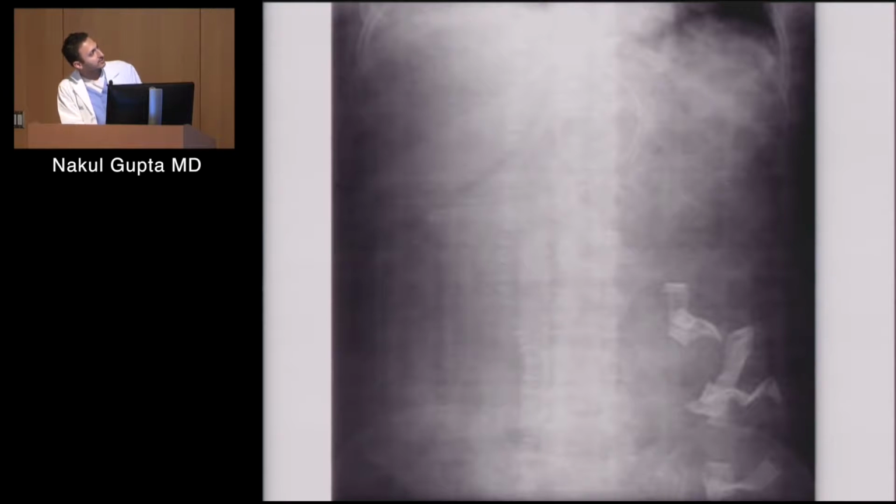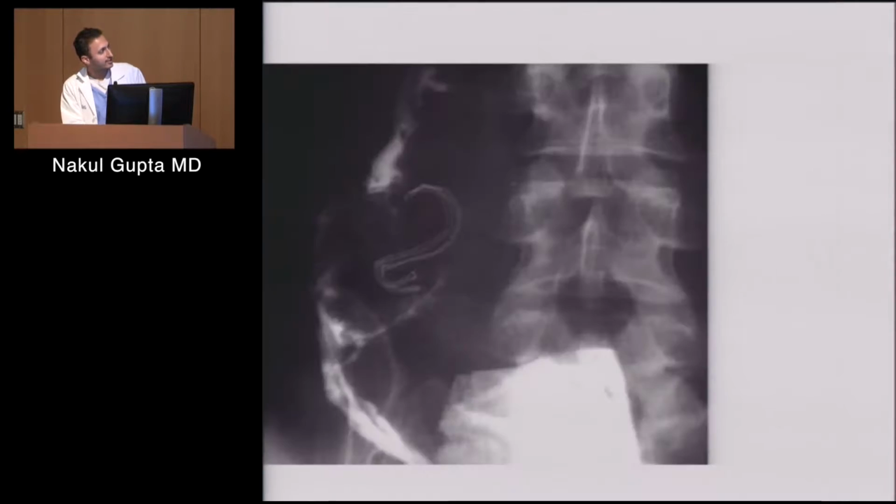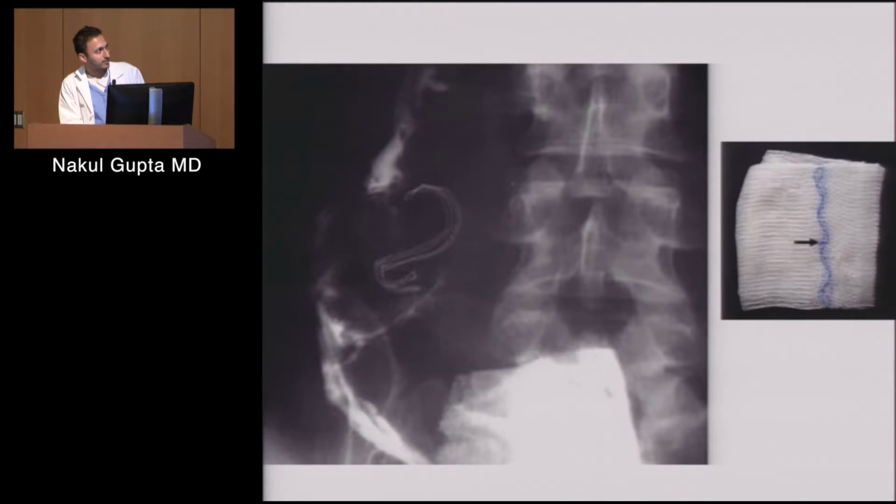Okay, what do we see here, guys? Yeah, this guy has staples. He's had surgery. And whoopsie daisy. Yeah, so this is the radiopaque marker on a lap sponge here, or multiple ones in this case. Now, granted, maybe they're planning to go back anyway and take them out, so no big deal. Same thing, you have this curvilinear radiopaque structure. This is what lap sponges look like, and this is what gives you that radiopacity, that line.